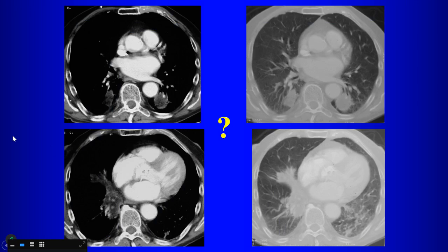And then here's the CT. So what can we say on the CT? Yeah, so you have bilateral consolidations in the lower lobes. What's the attenuation? Fatty attenuation. Yeah, so these are fatty attenuation consolidations, right? So your diagnosis is what?